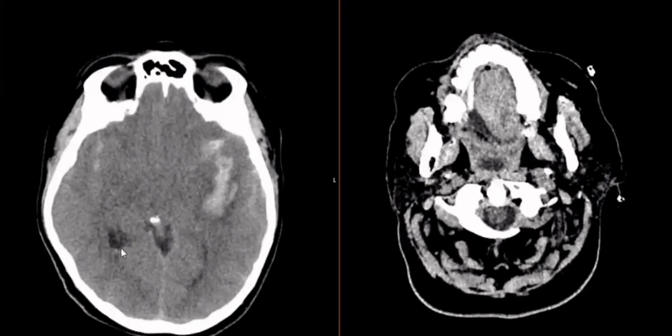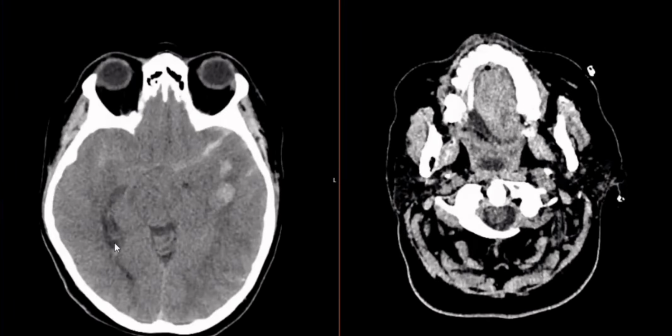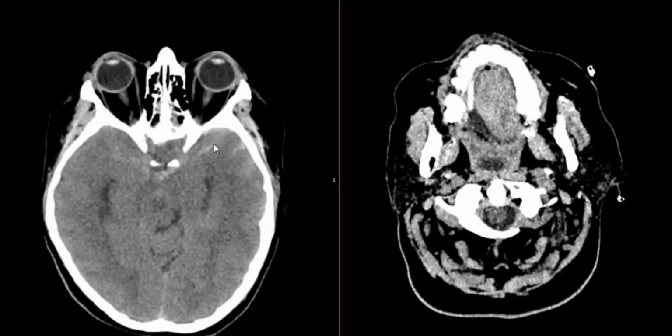So water is darker. You've seen the ventricles here. That's the shape of water. That's the color of air. That's the color of bone. And blood is thicker than water, so much whiter.